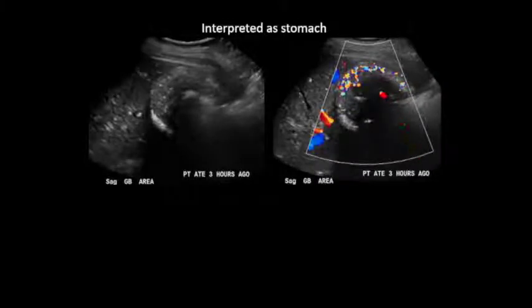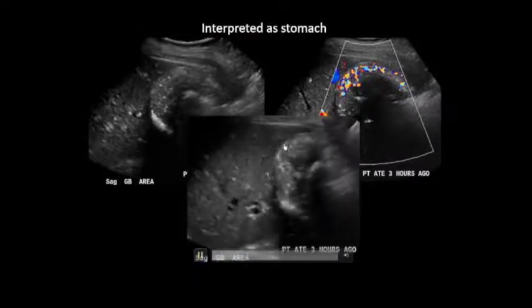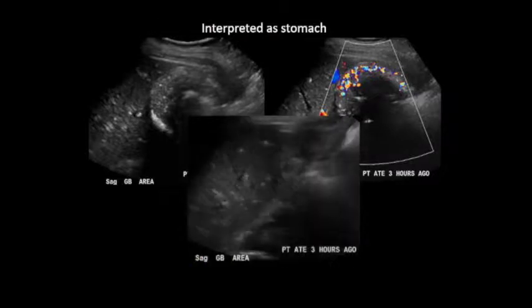The opposite can happen also. This thing here was so weird, okay, and somebody put color on, and it just looked so crazy that they labeled it stomach. Said patient ate 3 hours ago. That was the debris in the stomach. When in reality, if you look again at the cine clip, that's the gallbladder with stones down there. There happened to be a cyst in the liver nearby.